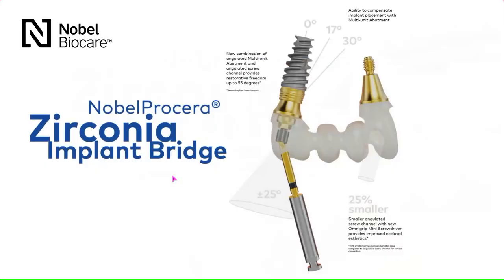Now, one of the main advantages of the NobelProcera zirconia implant bridge is that we now have the ability to do the angulated screw channel, or ASC, on top of the multi-unit abutments within the NobelProcera zirconia implant bridge. So now we can achieve up to 55 degrees of restorative angulation with the bridge on the case. Now, that's not to say that we hope we're getting implants inclined at 55 degrees, of course, but we do have the freedom within the design in exocad now to bring those screw channels exactly where we need them to be for both strength and aesthetics of the case, and Chuck will share that with you.